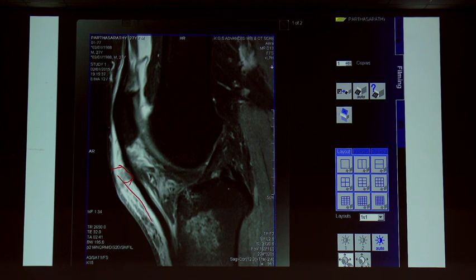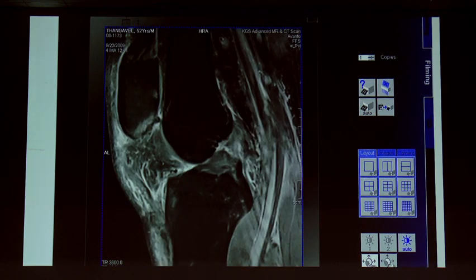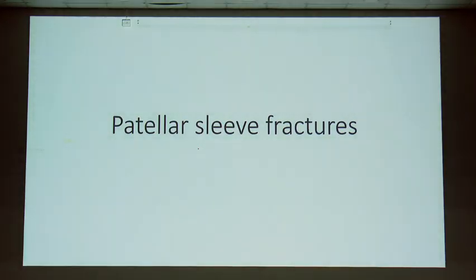And if you are carefully evaluating, you can see the complete rupture of the lower portion. It is ruptured and there is a hematoma anterior as well as posterior to it. It is a total avulsion. You can see the extensor injuries here are so severe. There is no patellar tendon at all. If you look carefully, the ACL is totally gone and the PCL is also totally gone, and there are avulsion injuries. So it is a floating knee, almost a dislocated knee joint. So almost the entire thing has gone anterior to posterior. So all these things we have to look into carefully.